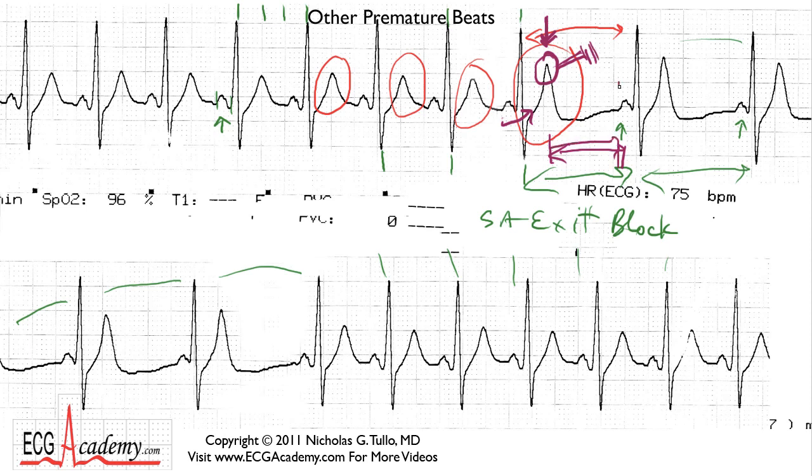Okay, so then here's the next sinus beat, but then it happens again. This T wave is again very tall because there's a blocked PAC, non-conducted P wave, that creates this pause in the rhythm, and then it happens again. You've got another P and then a non-conducted PAC here.